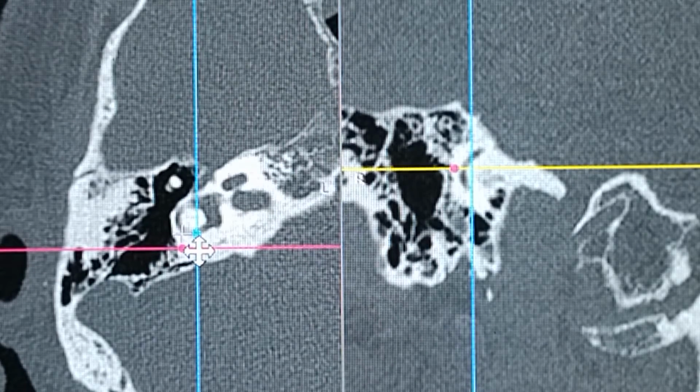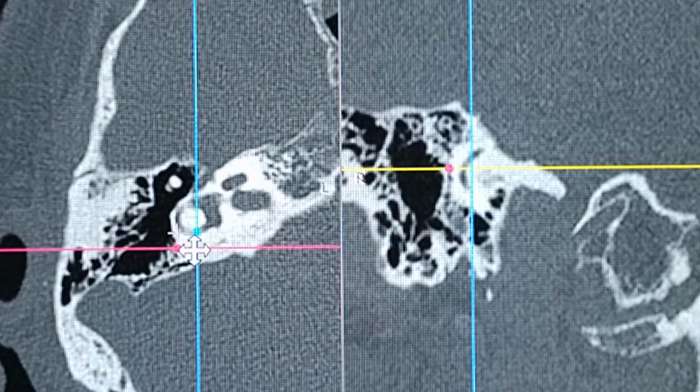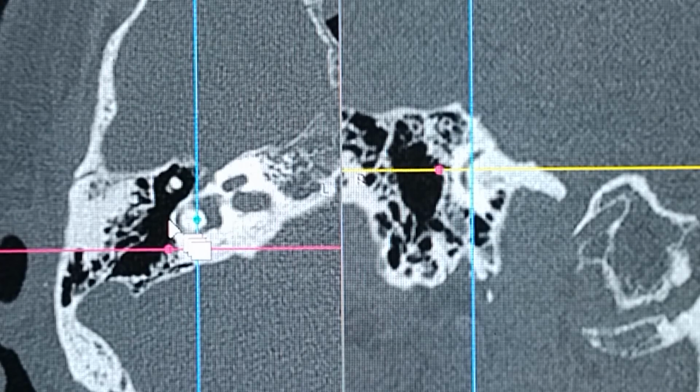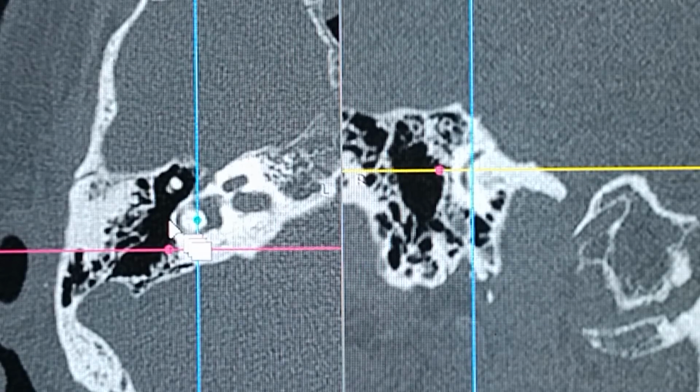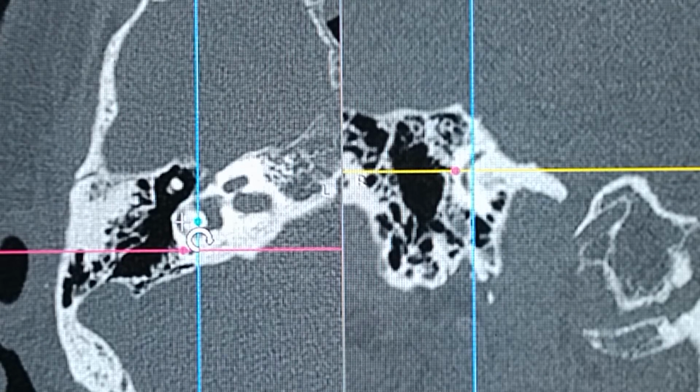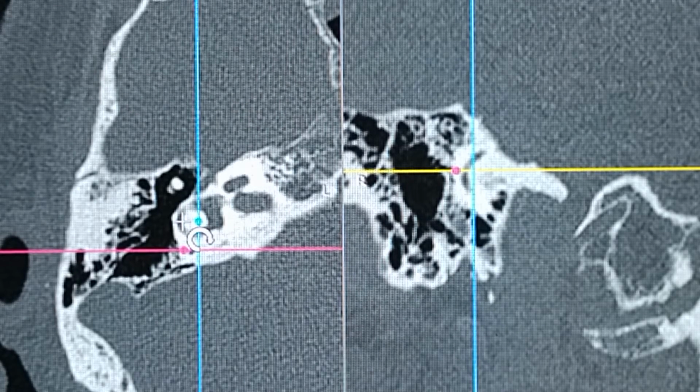It's the lateral canal. So if at all there is a bony dehiscence on the lateral canal wall, you can see that the bone is quite intact on this patient's CT scan, lateral canal. So if at all this bone is dehiscent and this canal is breached, the patient will definitely have something with giddiness, and that is called as lateral semicircular canal dehiscence.